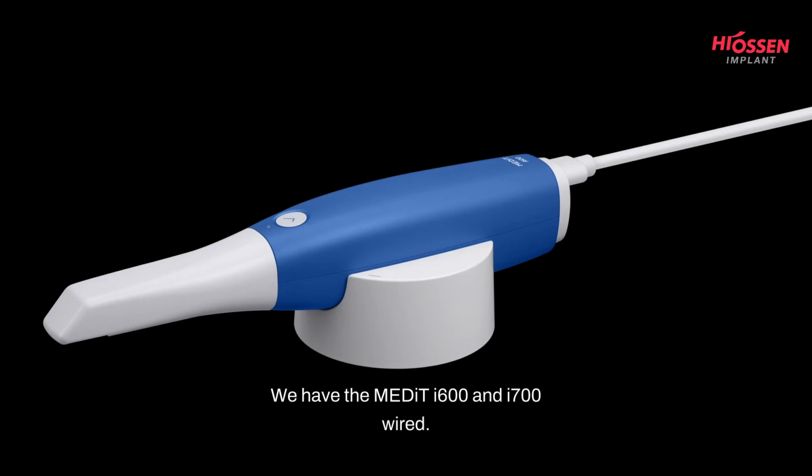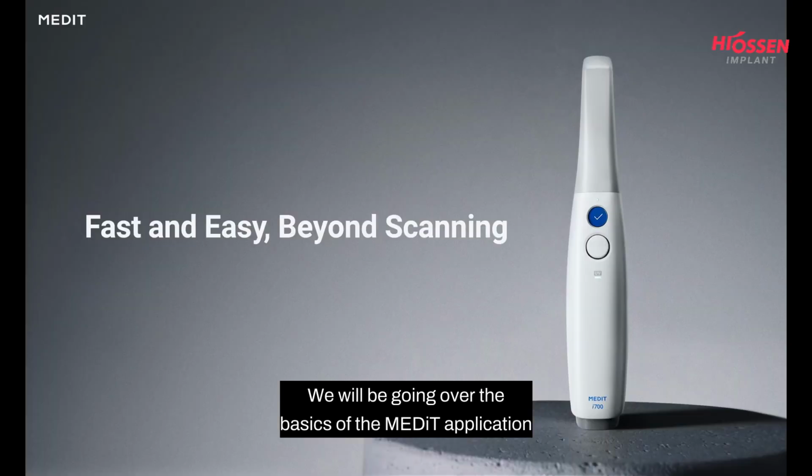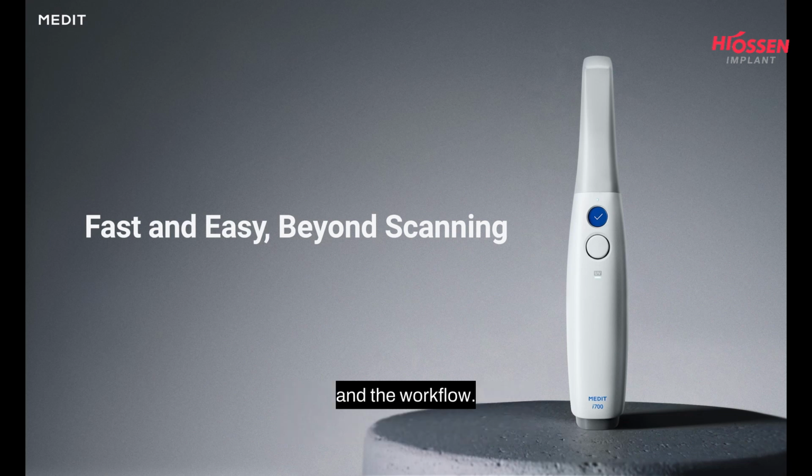We have the Medit i600 and i700 wired. We will be going over the basics of the Medit application and the workflow.